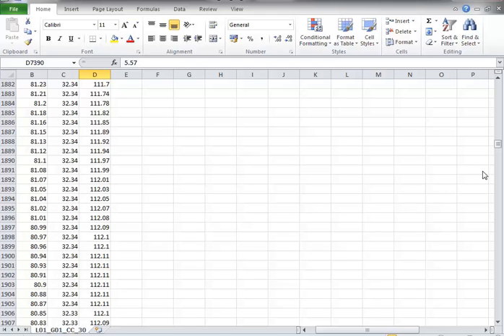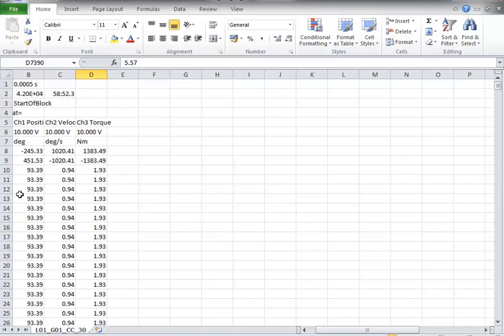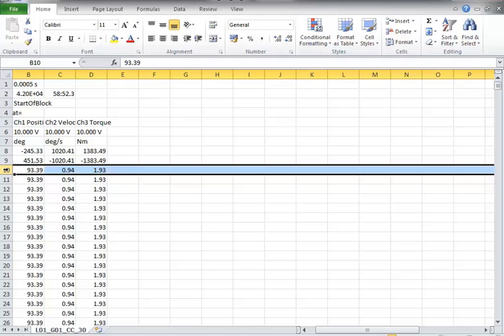So now let's look at how we can use Excel in a clever way, to save us time searching through for those maximums and to be sure we get the maximum. So we're going to calculate a maximum value now for this column. A way to do it is to go to the top of the column of data, right click on the row number, and we can add an extra row within that data.